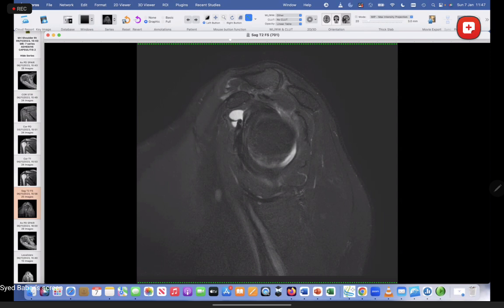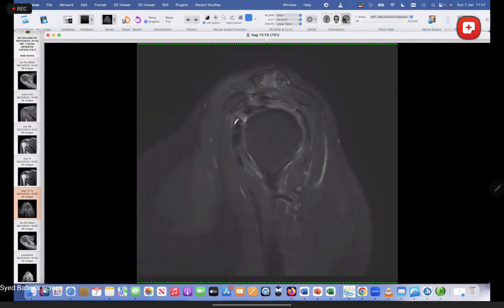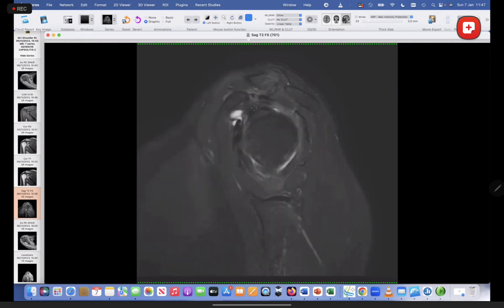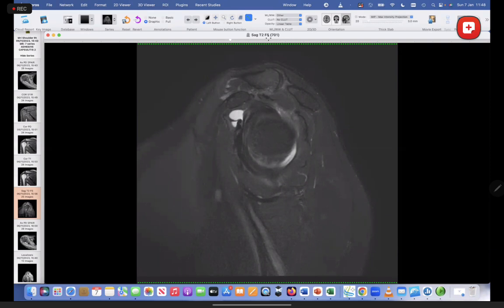The biceps tendon. So let's find out where the biceps tendon is. The biceps tendon is here. So remember the supraspinatus, subscapularis, what sits in between the two? The rotator cuff interval. And what runs through it? The biceps tendon. So that's your biceps tendon. So what I'm asking you is, what is this? Any other ideas, guys?